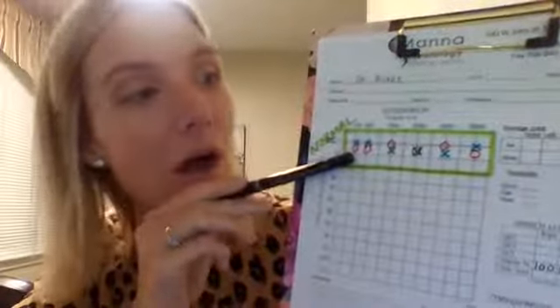So you can see up at the top of this chart is what we consider the normal hearing range. The further down the chart you go, the worse hearing gets, okay? So you can see that this person has completely normal hearing. All of those marks are in that green box. Now, on the flip side, let's see what it looks like for someone who has a hearing loss.